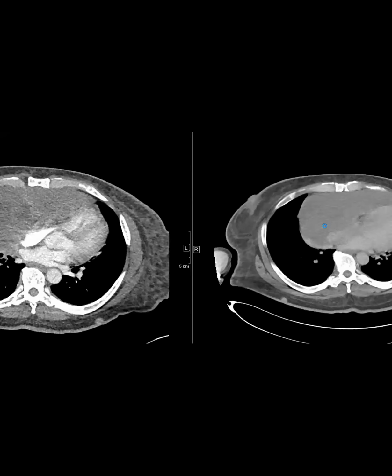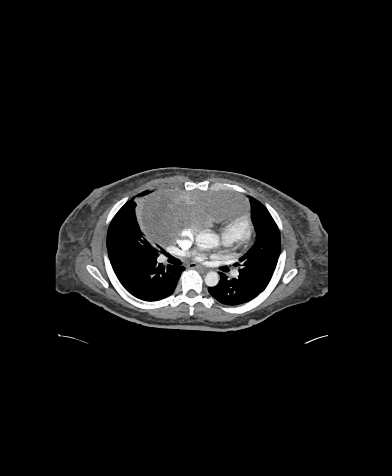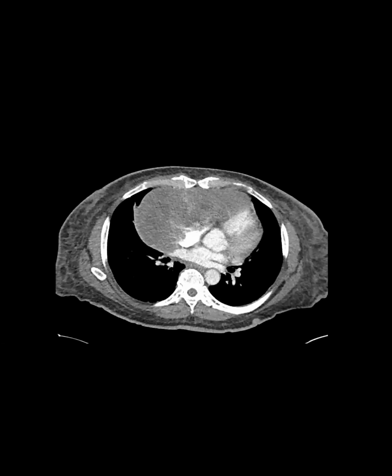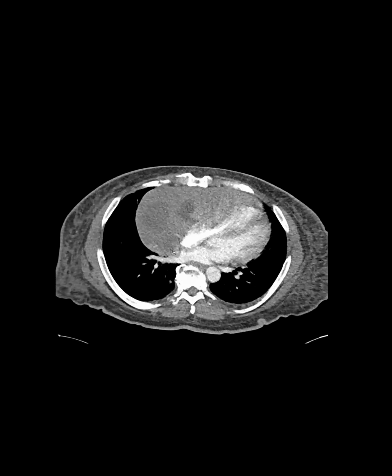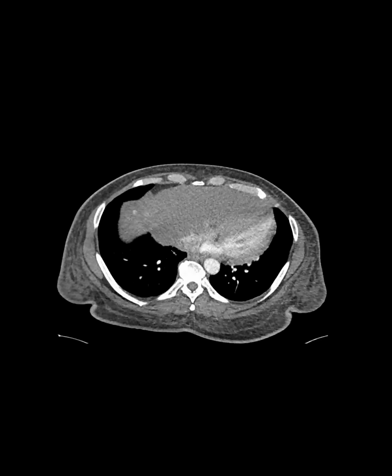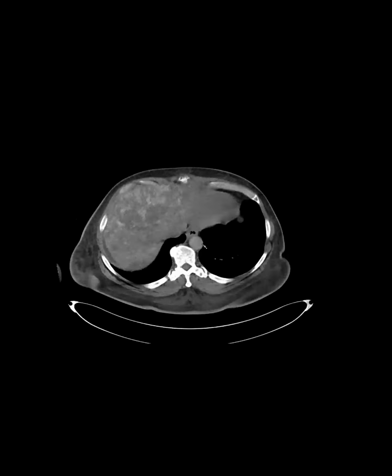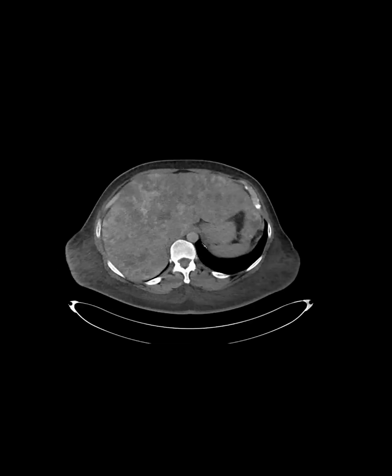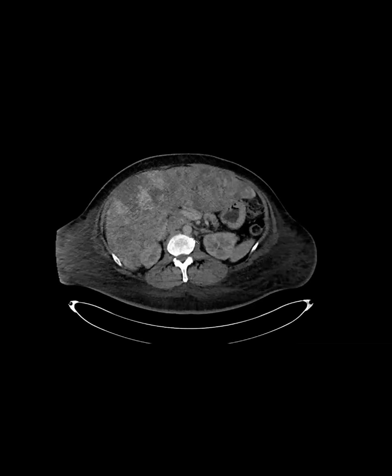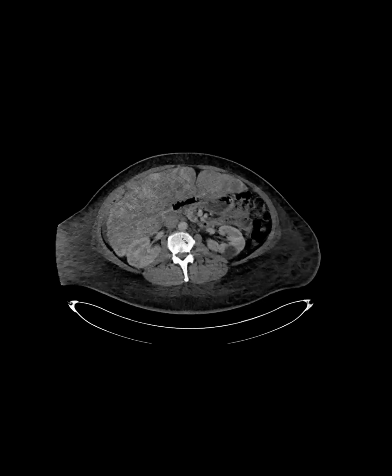Here's one more. This is the chest, an anterior mediastinal mass. We talked about this a couple of weeks ago, the 4 T's: could this be thymic carcinoma, thymoma, thyroid tissue, terrible lymphoma, or teratoma? And then in this patient, they also have something in their liver. Any thoughts?